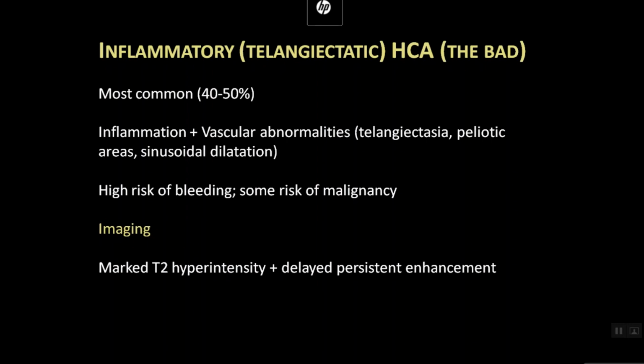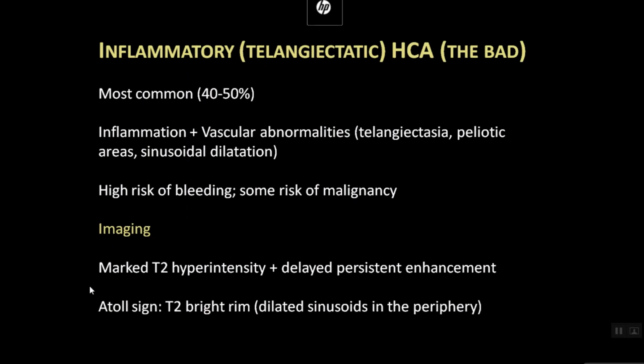So classically they say marked T2 hyperintensity. Okay. I've often seen that it's not that marked. I mean, it's bright, but it's not super bright. But there will be delayed persistent enhancement. So these are two things. There's this sign called the atoll sign. Okay, so the atoll sign.